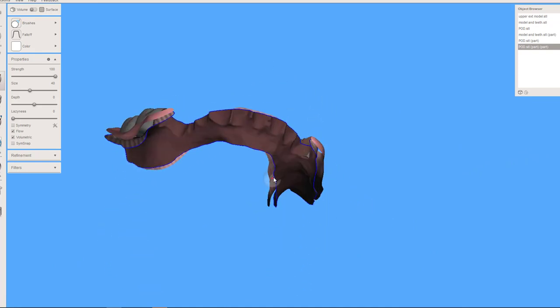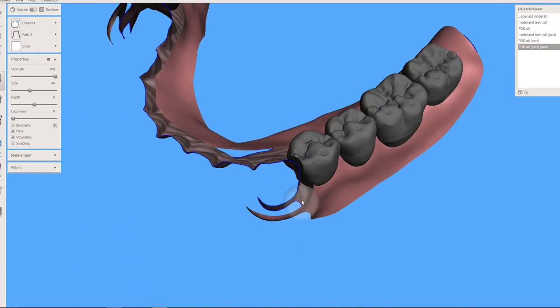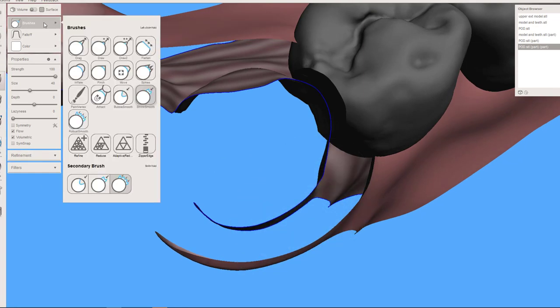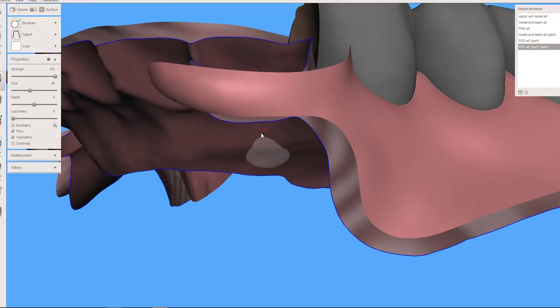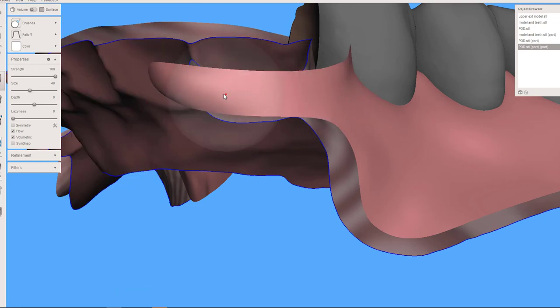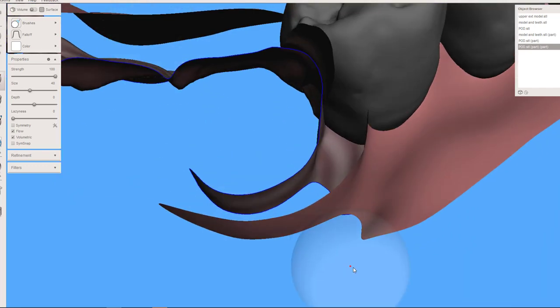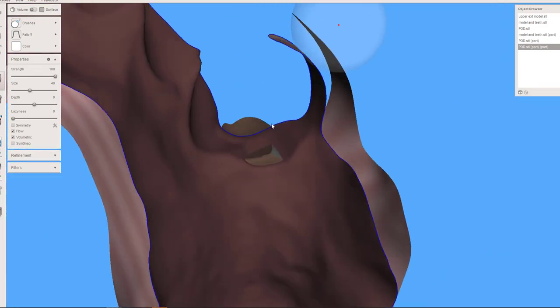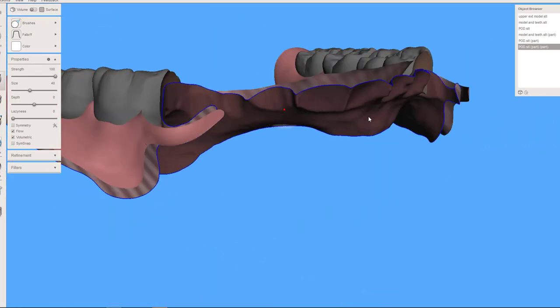So at this point, now I could go ahead and join them. Now I am thinking that clasp is going to probably be very, very rigid unless I shrink that back a little. So let me try shrinking that just a bit. I can see here how I'm altering the thickness as I do that. And I'm just eyeballing it. That's all I'm doing. Okay, I like that better.